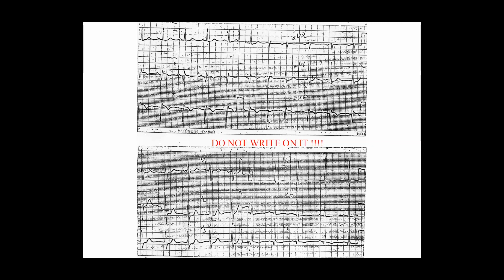All right, let's see. I would say it is rhythmic. Okay, good. The heart rate is about 100 or a bit less than 100. It's between 75 and 100, so it can be 80, for example. Okay, good. So it's normal.